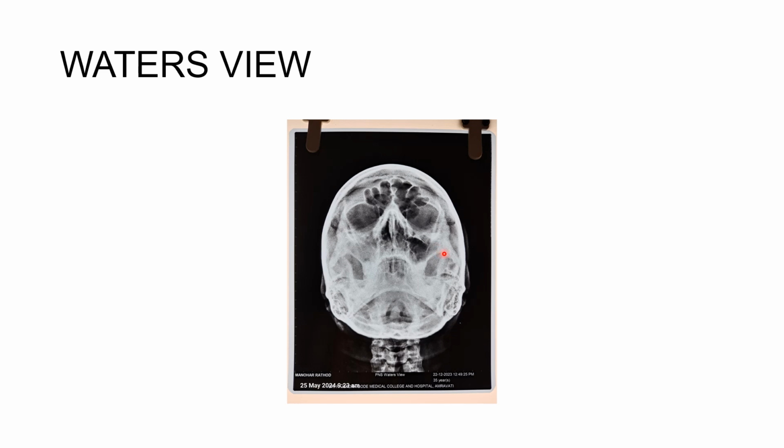Then these bones at the sides are the cheek bones. What are they called? Zygomatic bones. You can see so many things in this. Try to name as many facial bones as you can. They can ask you how the orbit is made, the orbital cavity, the lateral wall, the medial wall. So try to revise all your osteology before coming for the radiology exam.